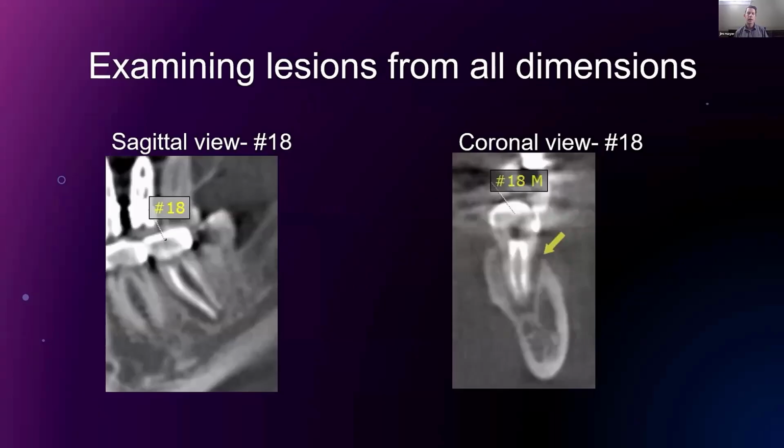So I think we're going to be moving on to the next portion of examining some lesions. Dr. Boccolini, you are going to be taking us through some of this? Yes, I'm going to be talking about the importance of looking at the lesion from different planes. I'm going to show a few cases. Sounds great. Okay. So this is the first case I would like to show.